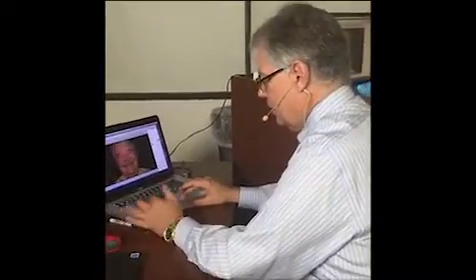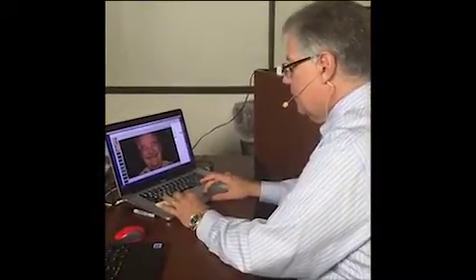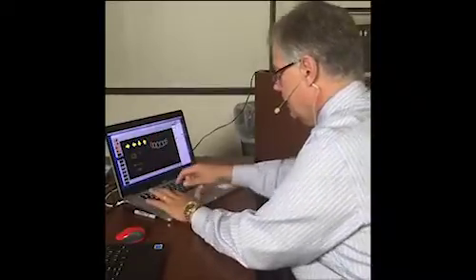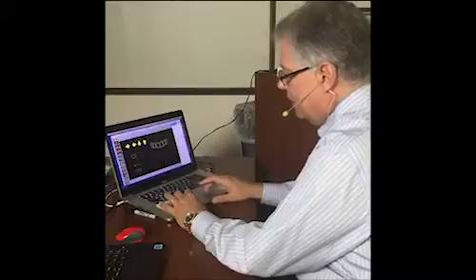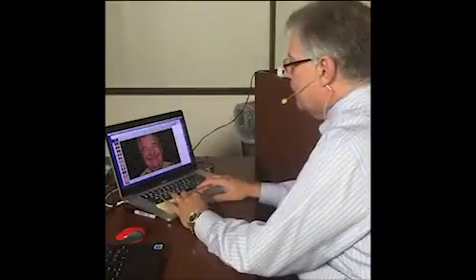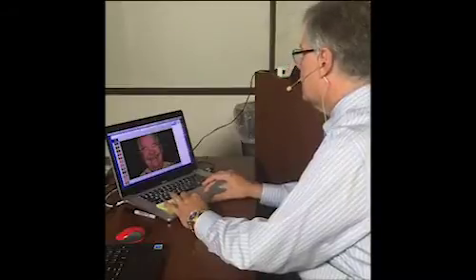I could go and grab a line or an arrow down here. I'll show you all those in a moment. There's a slide here that has lines and stuff. In fact, we'll do that. We'll copy a line. Command C to copy the line. I can go to the picture I want to put it on and go Command V. I can grab an end and stretch it out. What I could have done is gone up to a shape.